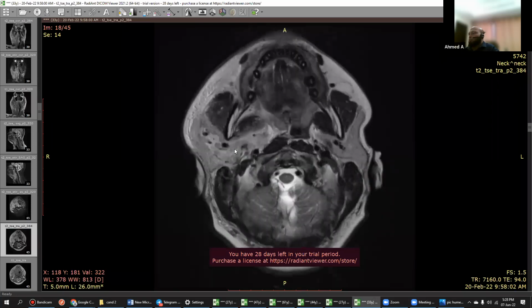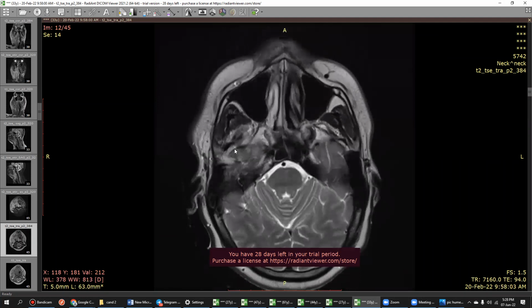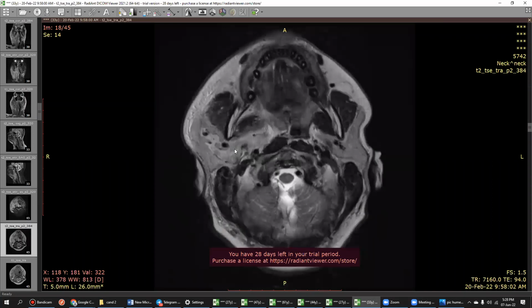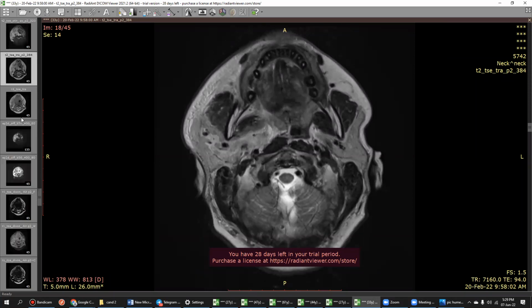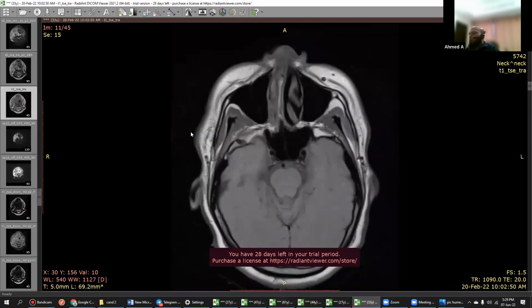Yeah, right. So multilocular hyperintense lesions on the right side of the neck, specifically in the submandibular and the parotid gland, extending medially to the parapharyngeal region and to the root of the tongue. And they are ill-defined in outline. I would like to see the other sequences just to delineate. Maybe contrast enhanced CT or MRI will be helpful. Whenever you are asking for contrast, first you should ask for T1, because contrast goes with the T1. So just look at the T1, then I'll give you contrast.